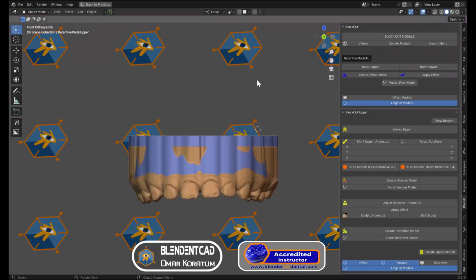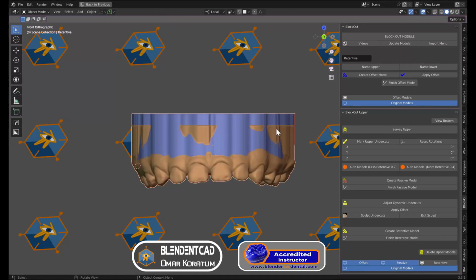Before proceeding to the Splint module, now I'm just going to do some measurements and create some safety zone and the cutter to proceed with our crown lengthening guide. I'm going to design safety margin and the cutter for the combined crown lengthening soft and hard tissue.